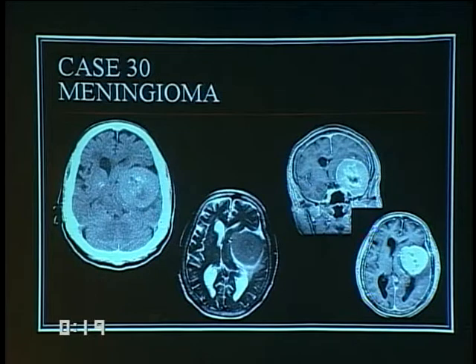A partially calcified, partially necrotic mass with a thin rim of edema on CT. All these findings are confirmed on the pre-contrast T2 image, and the necrosis and marked enhancement of this mass with a little bit of midline shift. This thing has been here for a long time to be able to grow this large, and must have been there for a long time to only have that little bit of edema. One would think that the patient would notice things weren't quite right well before something got this large.